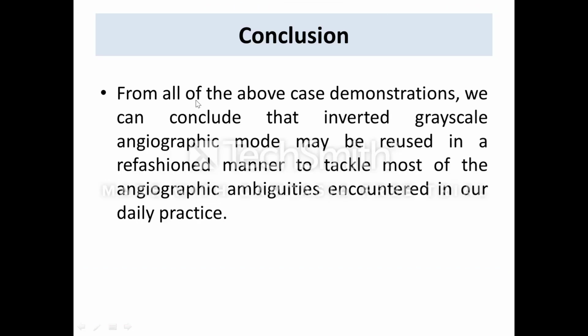So to conclude, from all of the above case demonstrations, we can conclude that the inverted grayscale angiographic mode may be reused in a refashioned manner to tackle most of the angiographic ambiguity or ambiguous coronary lesions encountered in our daily practice.